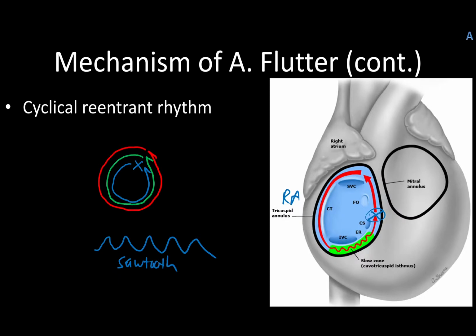That's what makes this really cool. And it's that absolute refractory period that really kind of judges how quickly this kicks through. But it is rapid. It's as fast as the heart can physically recharge itself and go again, which is why you're looking at rates of 250 to 300 beats per minute in the atria.